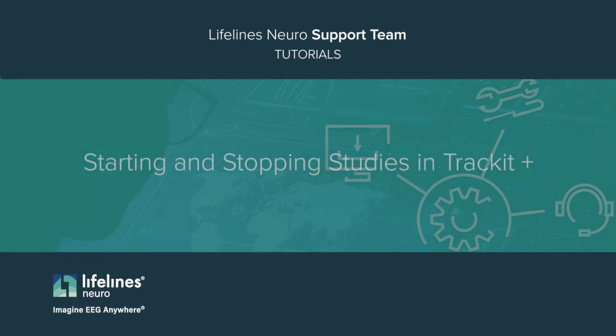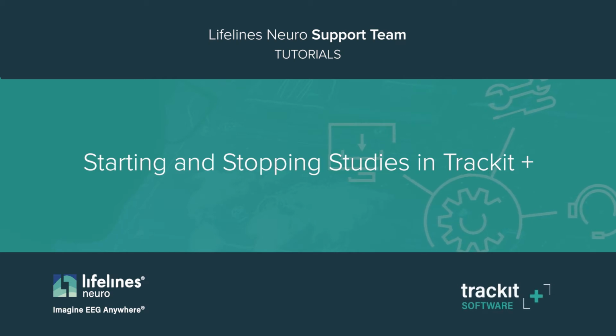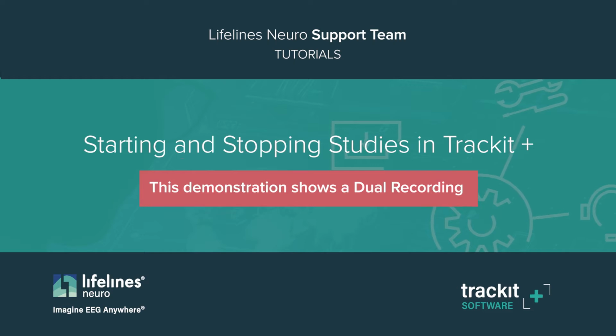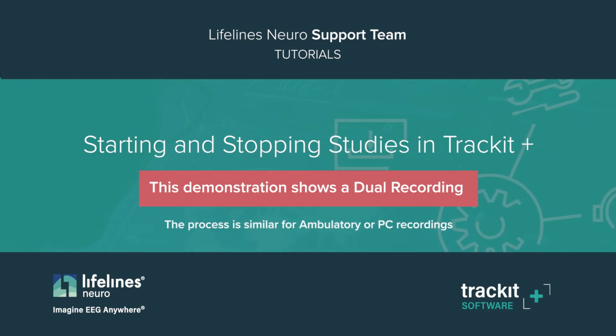Today, we are going to walk you through the steps of starting and stopping different types of studies in Trackit Plus. For the purposes of this video, we will discuss a dual recording. Other recording options would include an ambulatory recording with your amplifier only, or a PC recording.